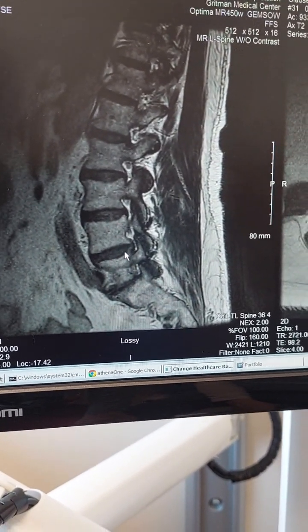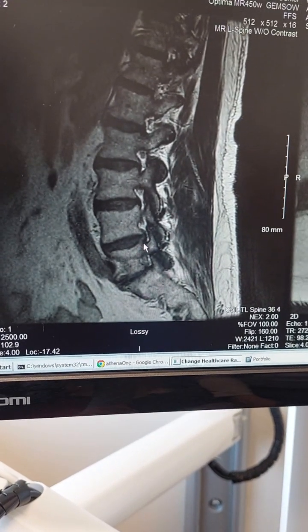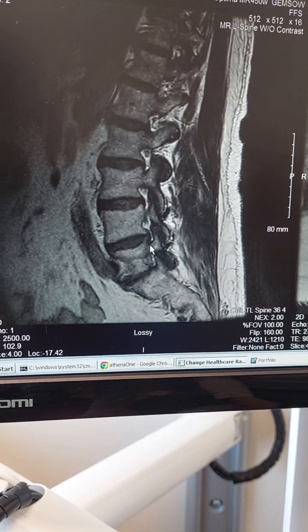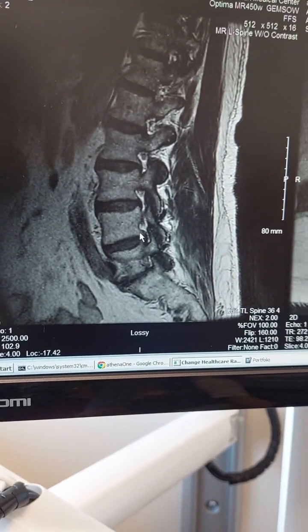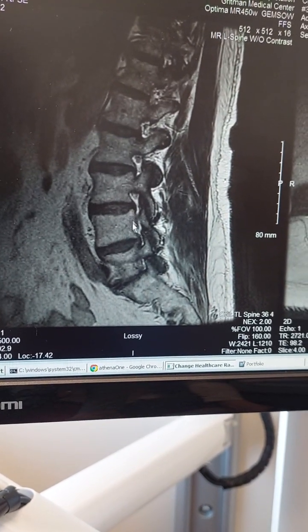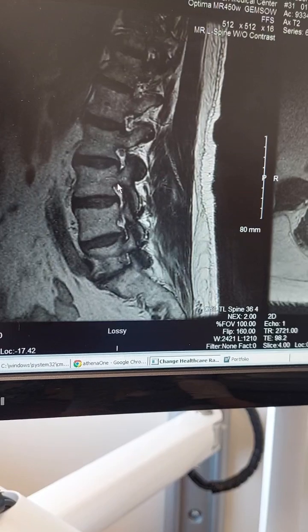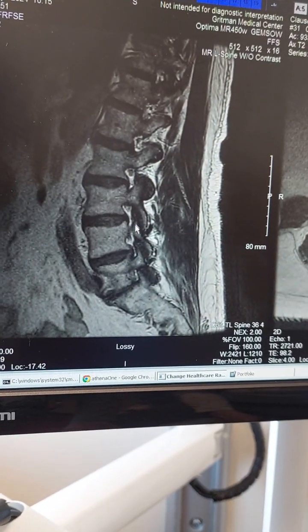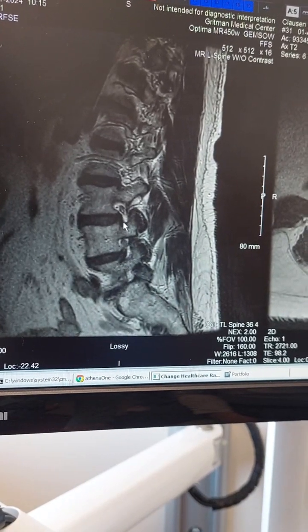Definitely. That's because the disc is bulging into the bottom half of that foraminal opening, and the disc bulge is occupying the majority of that space at these levels. So the nerve gets pushed up into that upper 50% or even upper third of that opening.